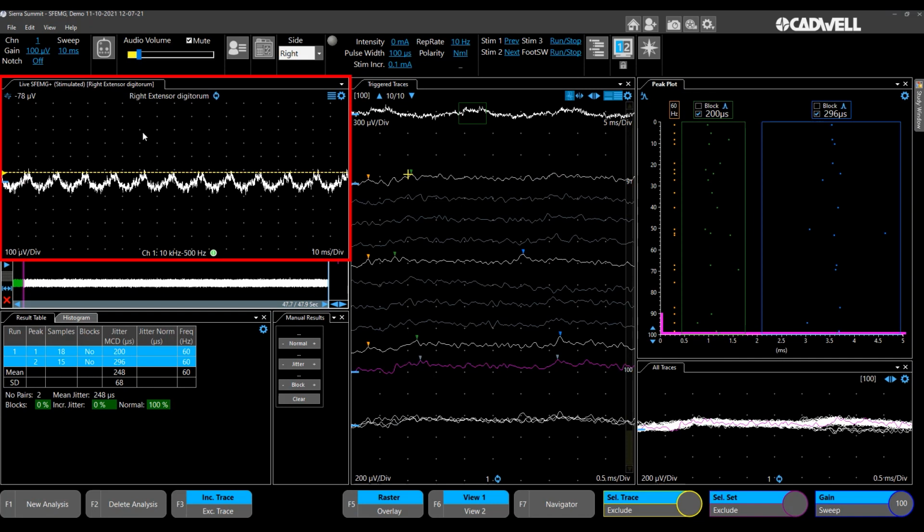And just so you know, the yellow knob will actually adjust the trigger line. So like I said before, the trigger is enabled to be in auto mode by default, but by turning the yellow knob, you then have manual control of the yellow trigger line. You can also adjust it with your mouse.